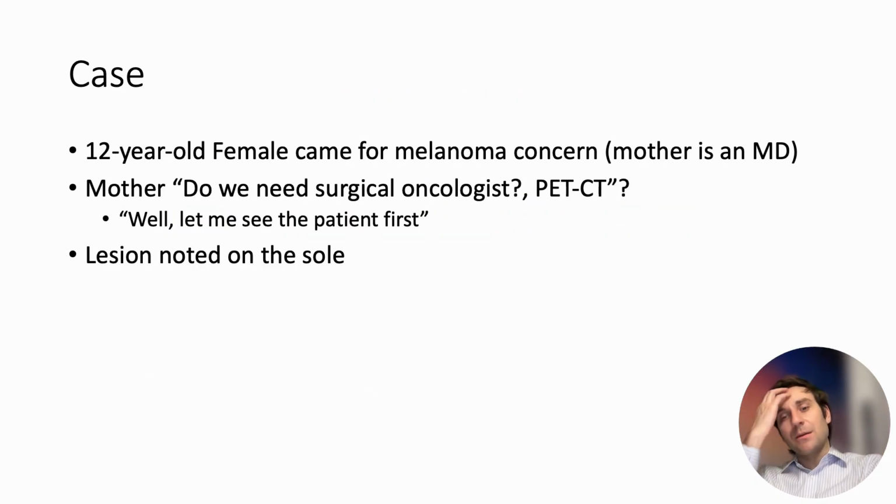And let me show you an example here. This is a case courtesy of Natalia Jaimes, who is there with you guys. So this is a 12-year-old female. She was referred for melanoma concern. The mother is an MD, so of course, threshold for concern is lower, right? So the mother was really concerned, asking us, do we need a surgical oncologist right away? That my daughter needs a PET CT, right? And of course we say, well, let me take a look first, right?